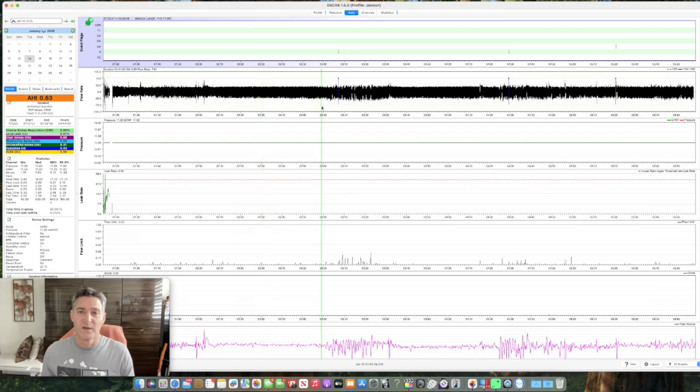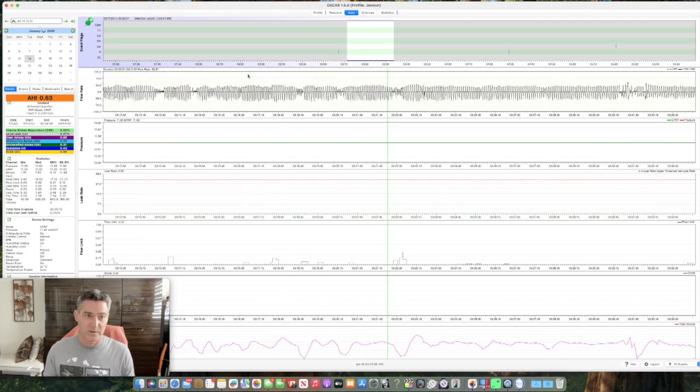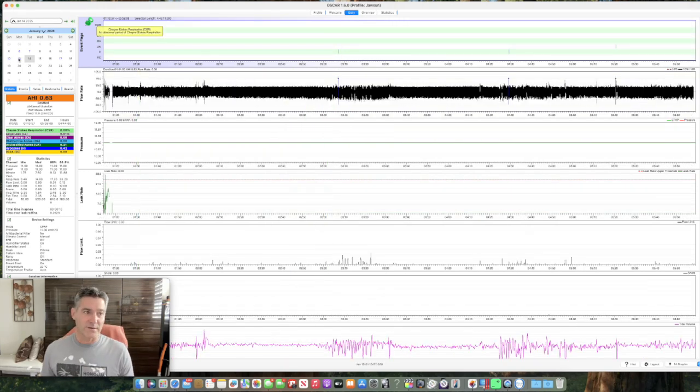Phenomenal program. So if I want to look at some stuff like, okay, hey, what's going on here? What's with all these flow limitations being flagged? I can see what's actually occurring. And, that's weird, it got fooled by REM. This is just a REM breathing pattern. That's it. It's just a REM. And it's like, flow limitations. No, it's not.